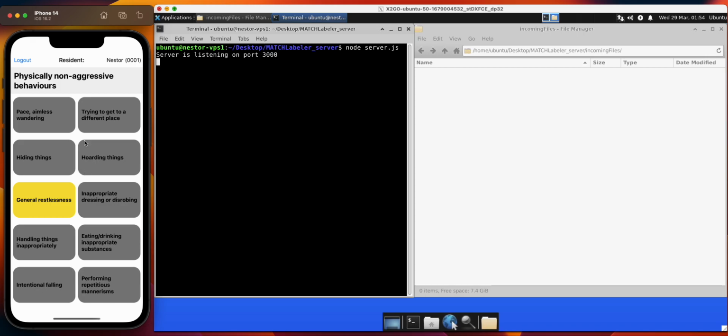Every action that we do here, as I said, is going to be transmitted to the server. At the moment, I just put a timer of every 30 seconds. Every action should be sent, but this can change to another time, for example, 10 minutes or 15 minutes. It will send everything that you're doing here to the server.